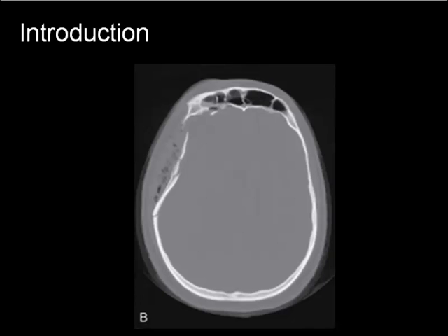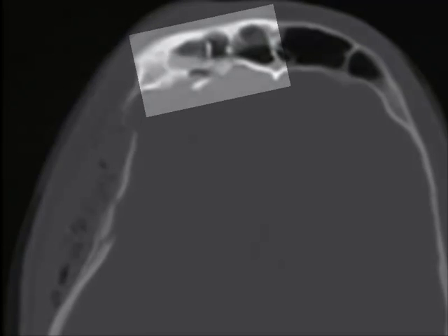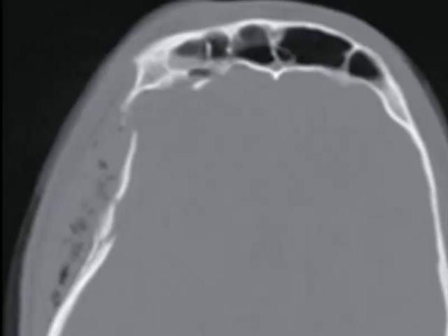The screen image here demonstrates a comminuted and depressed fracture of the lateral aspect of the frontal and right parietal bones. Notice the air density superficial to the bone fragments, which is called subcutaneous emphysema. There's also fluid density in the frontal sinus. That's another result of the trauma. The anatomy of the cranium is going to be presented in this media module.